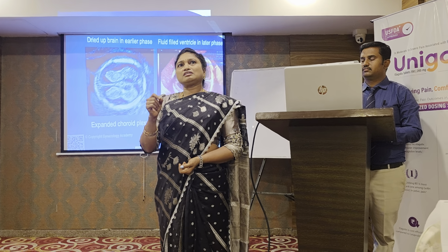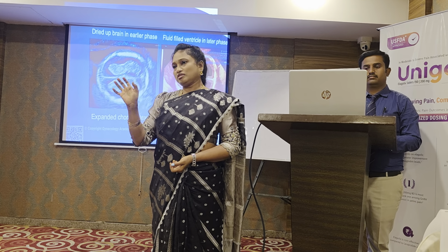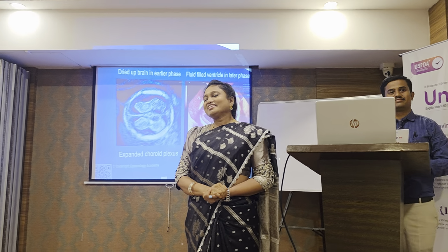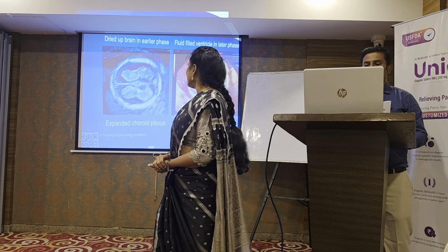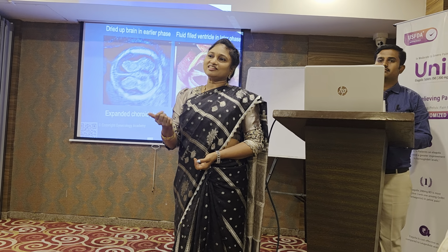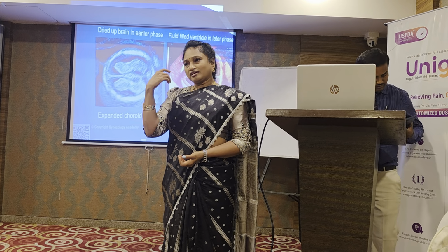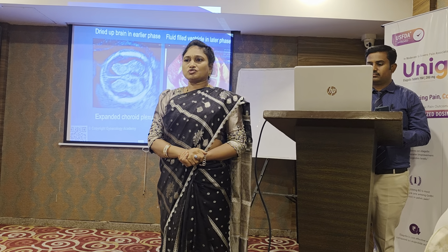Even what they say is, if the lateral dilatation of the ventricle is more than 12 mm, it's okay. But if there is just a marginal borderline dilatation, say from 1 centimeter up to 1.2 centimeter, then it may be associated with genetic abnormalities. So be careful with lateral ventricle dilatation. Mild variety is supposed to be much more dangerous than the severe variety. Actually, what the book says, up to 15 mm you can wait and watch, but always get a marker done. If possible, if the patient can afford it, go for microarray also. Next one.